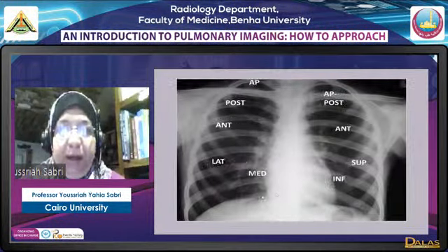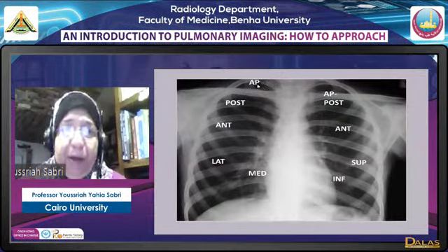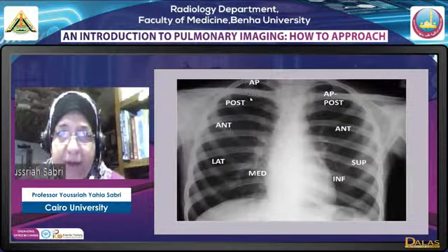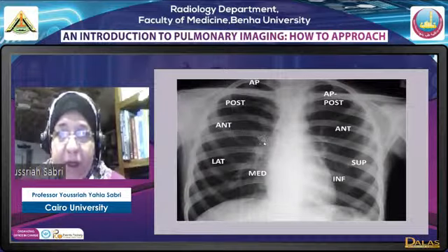Going to segmental anatomy, in the upper lobe we have 3 segments, triangular again in appearance, with the apex at the hilum and the base peripheral. The apical segment is apical. Below it we have the posterior segment, and the anterior segment standing on the imaginary line that we have drawn.